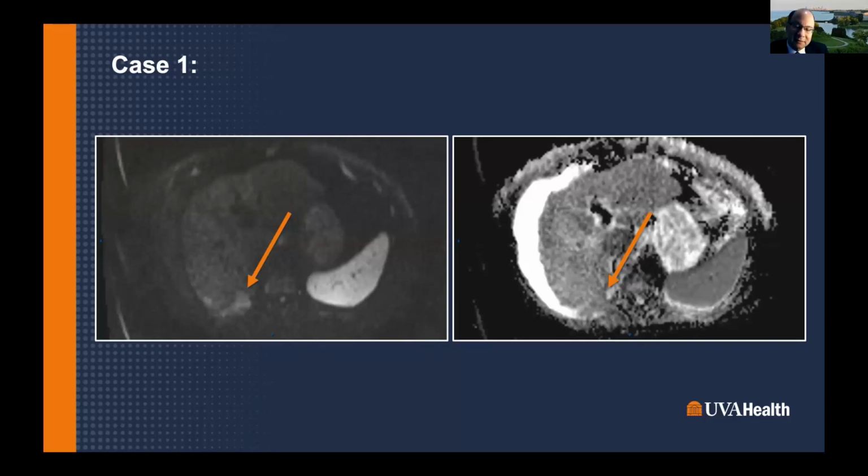Do you have a CT scan that shows it? I don't know if you guys do it, but sometimes they'll do Dyna CT at the time of the procedure, or some form of CT, to see if the lesion was adequately covered. And then the other thing is, if it's in the dome, then sometimes it's a different blood supply.